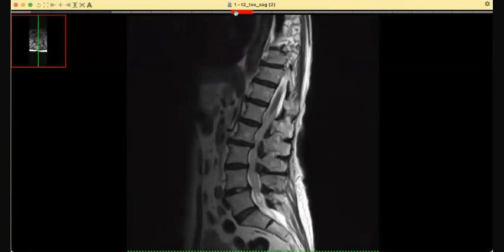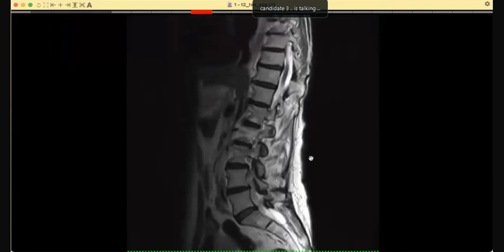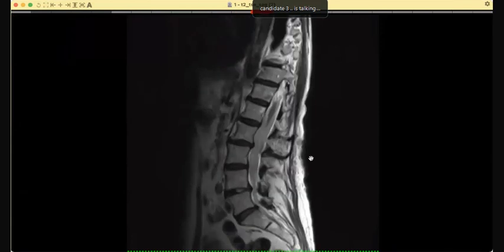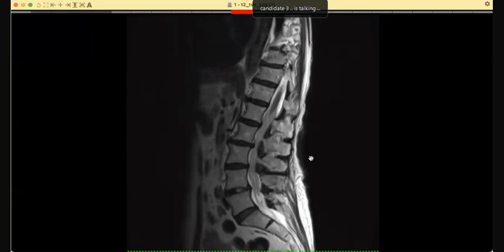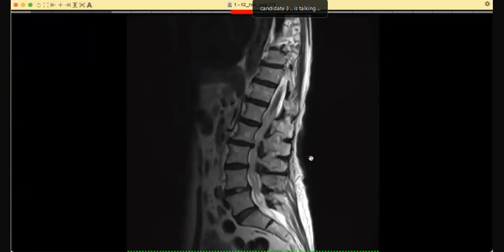There are intraspinal soft tissue masses, soft tissue sheets that are filling the thecal sac. And I can see that there is a patchy high T2 signal involving the vertebral bodies, bone marrow. They may be hemangioma. I will check the T1 sequence and see the signal of it later on.